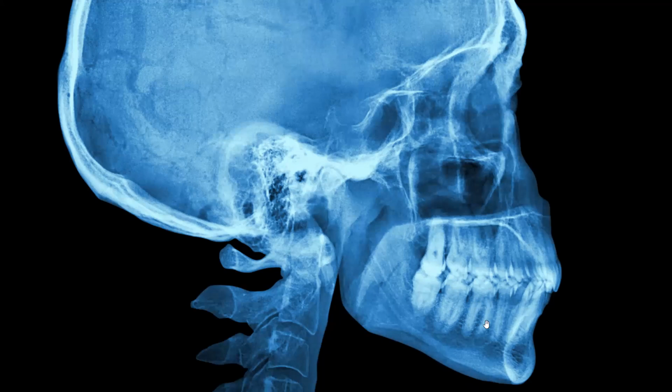Pulp chamber contains nerves, vasculature, which comes through the inferior. Here you can see this is the inferior alveolar nerve canal, which runs through the mandible. Okay, it comes up like this, and then supplies the vasculature to the roots of the tooth.